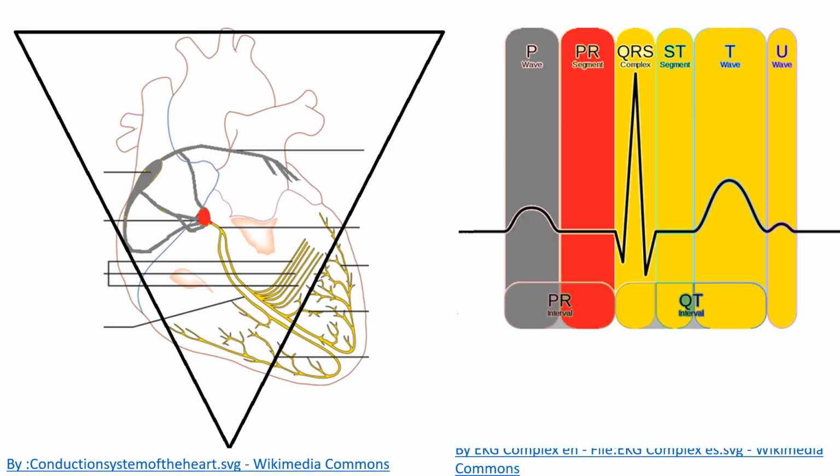Okay, so next thing we got is Mobitz type 2. So remember, this is going to generate the impulse that's going to become our P wave. So here we go, we got our P wave right here. Because of that, we're going over here to get our timer as electricity goes through there. We create our PR interval. And so everything is working beautifully until we get to here. And so sometimes they'll say ding, and now we generate a QRS. Other times they say eh, and we're all done, right?